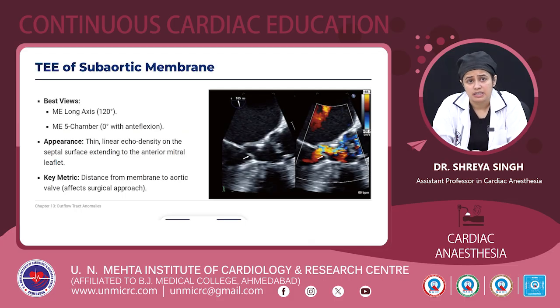On TEE, the best views are the mid-esophageal long axis view and the mid-esophageal 5-chamber view with anteflexion. So a thin linear echodensity on the septal surface extending to the anterior mitral leaflet can be seen, and there's turbulence around the membrane.